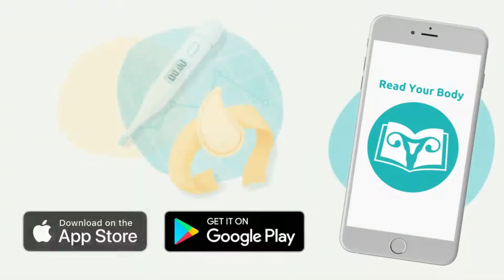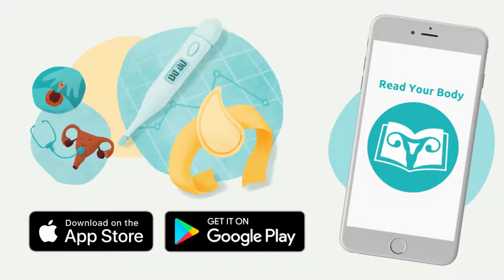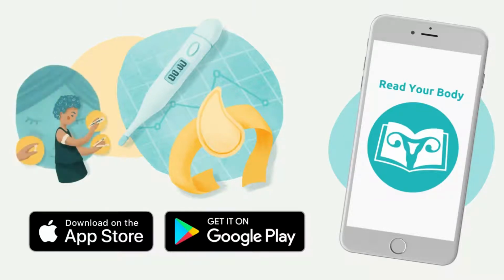In this video, we run through some options for charting temperature in the Read Your Body app. Waking or basal body temperature helps to confirm ovulation, which is the release of an egg from the ovaries and a vital sign of health. It's a key event in your cycles that can be tracked to help avoid pregnancy and forecast your next period.